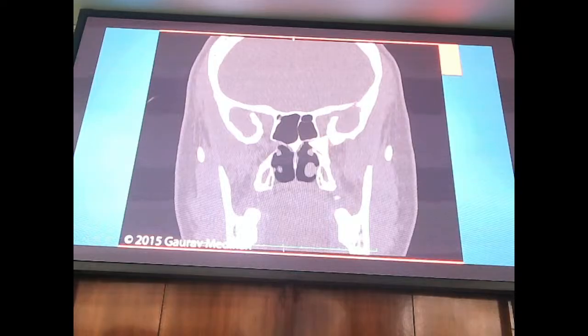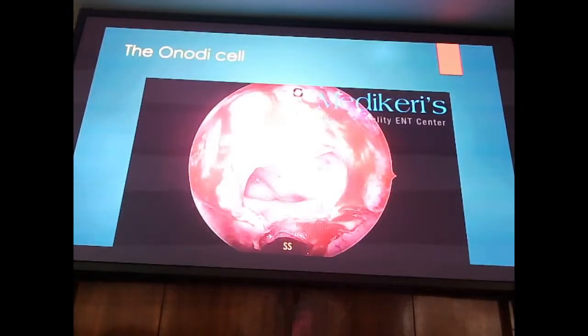This is again important in angiofibromas because you will see the pterygoid venous plexus. It's a torrential bleeder actually. It bleeds like crazy whenever we do a JNA. So that is one thing that you need to understand.